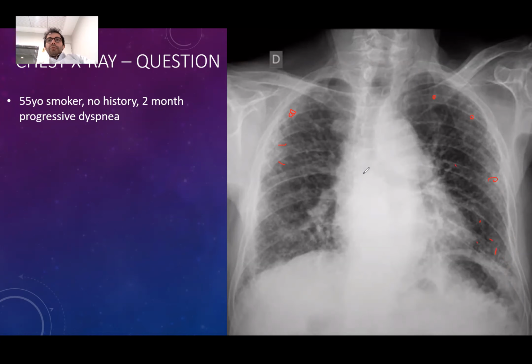So I'm seeing reticular nodular opacities and some peribronchial cuffing here, for example, as well. And this is the hard border. So this is not a consolidation area. Also, the aortic arc is prominent. We have to say this. We have to measure this. If it is bigger than 4 centimeters, we should send to the cardiology department, for example. This is the border of the descending aorta. It is going down. This is the aorta.